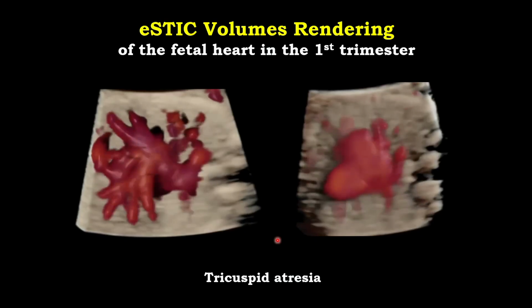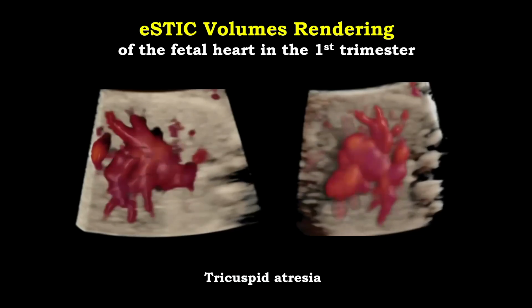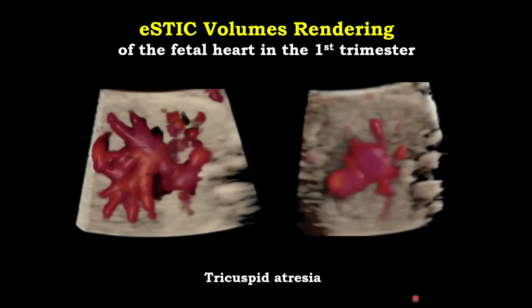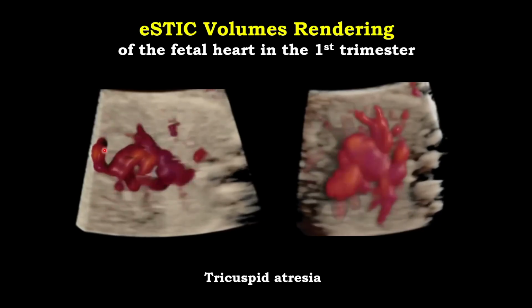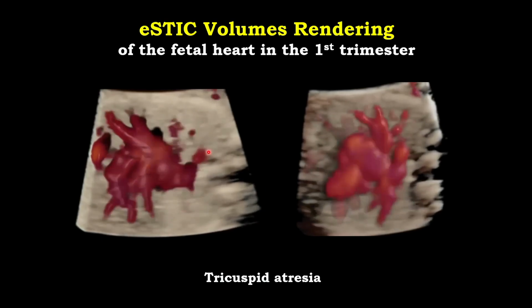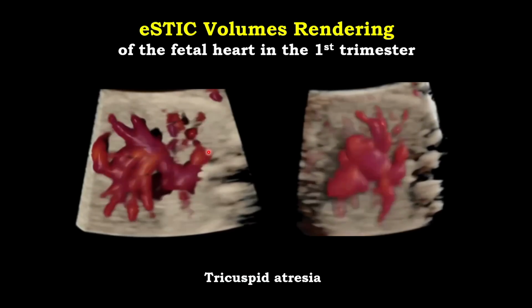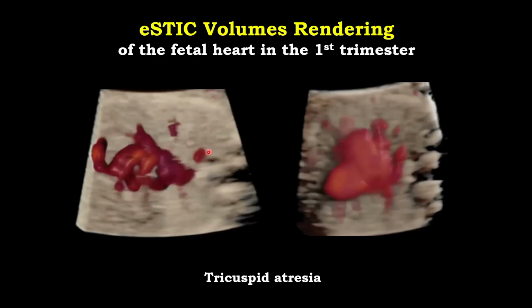Another example, here we have the tricuspid atresia, 13 weeks, 6 days. Here we look at one volume, but we can retrieve different levels. And this is at the level of the abdominal circumference. What can we see here? We can see the descending aorta, and next to that, an enlarged vessel, which is the azygos vein. Right away, we can suspect that this baby also has vascular problems, such as an interrupted IVC.